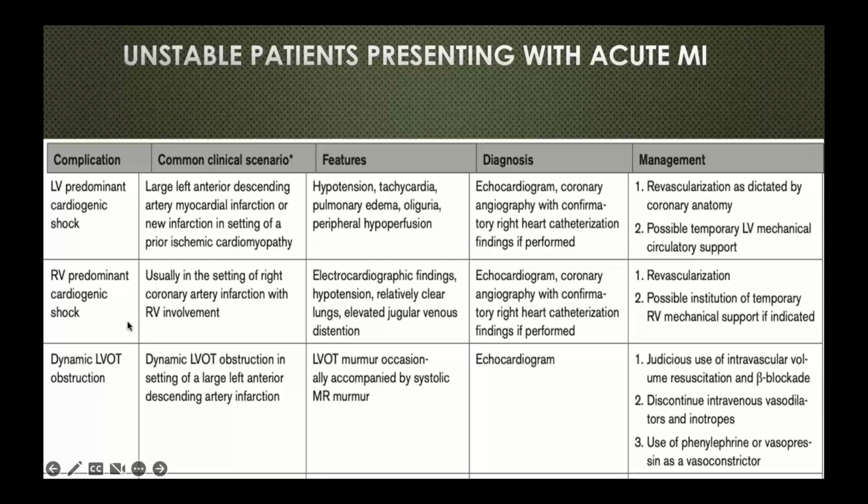Again, RV shock is very important. Usually the clinical diagnosis at the bedside is hard to make because all of these patients present very sick, but with good skills in echocardiogram you can recognize this condition promptly. I think one condition that is very important, and it's mostly seen in the CICU, is patients with a hyperdynamic LV and intracavitary obstruction, where echocardiogram skills are very important because it will shift the management dramatically, where you're going to stop using inotropes and start using fluids.